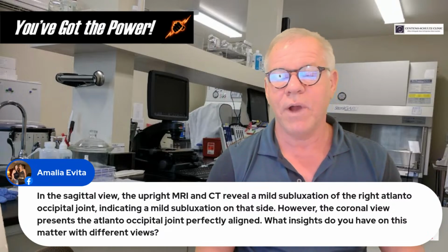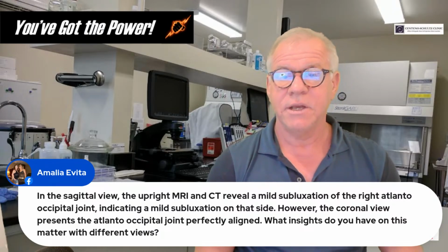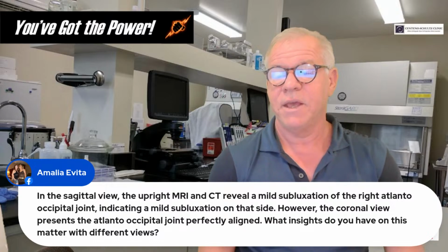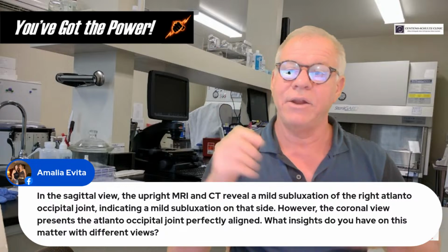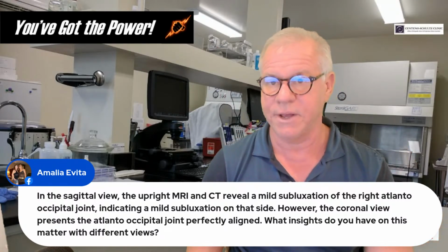Yeah, so what you're describing is axial rotation. What axial rotation means is that you've got C1 and C2 rotated a little bit. If you look at it head on, you're not going to see much difference on the corners. But if you look at it on the side, you're going to see that C1 is ahead of C2 or vice versa.